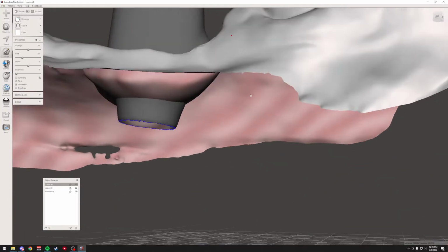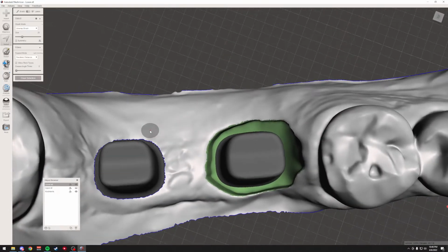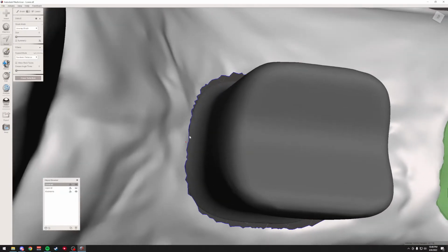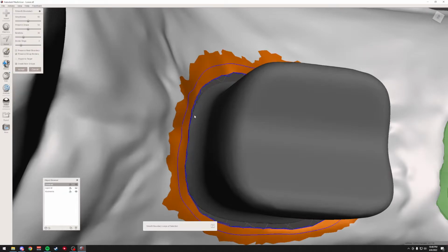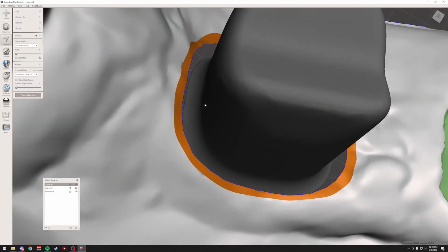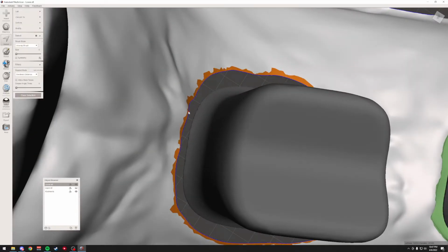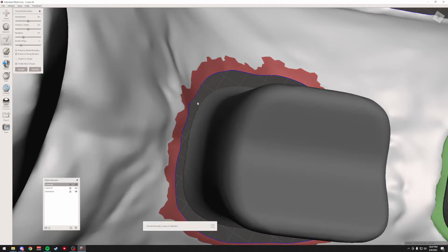So before we move on, we'll blaze through the second one in the exact same way. I'll talk through the hotkeys as I do it. We'll double click our line there. We're going to expand that ring twice, greater than, hit B, smooth the boundary. Okay. We'll hit X to discard that. And then we're going to go back, double click it again. We'll hit greater than, hit B.